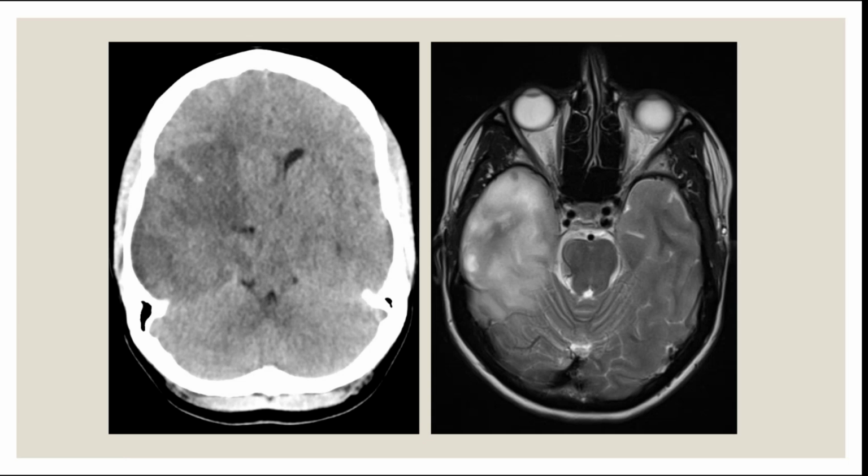We still have two more images, guys. Don't worry. I know it took so long, but we just have two more images. So let's start with the image at the left. What do you think, guys? Which imaging technique? What can you see?